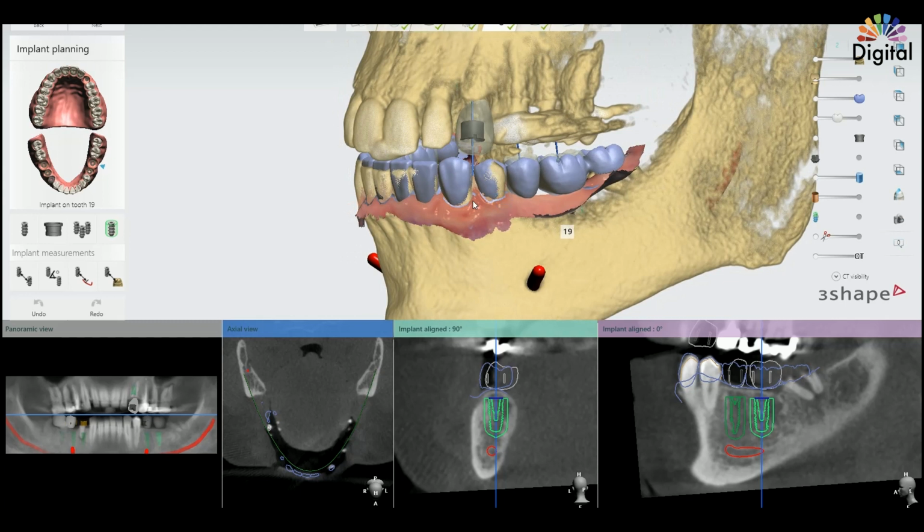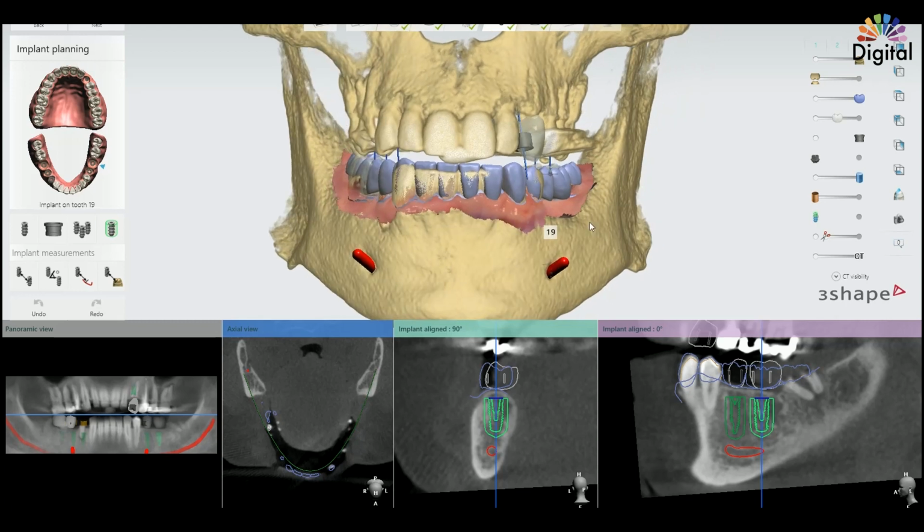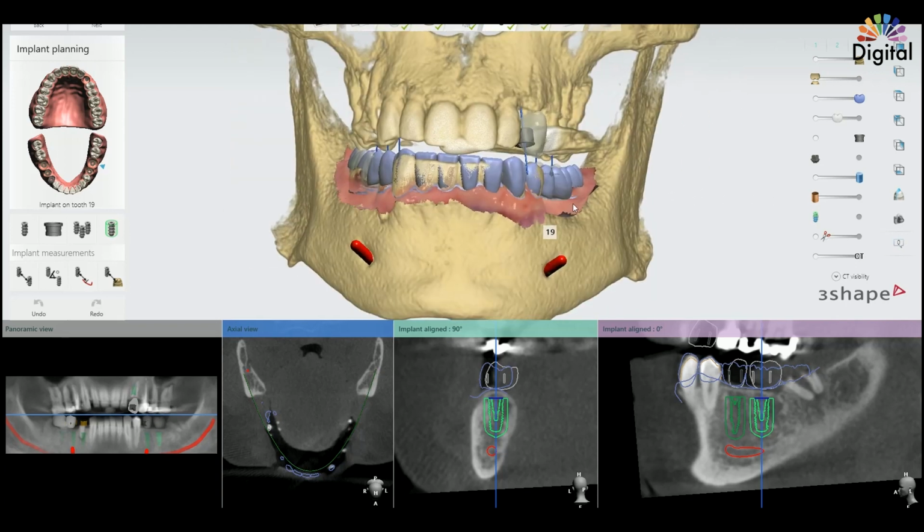And one thing, please guys remember, in the Implant Studio there's no merging or alignment function between the original scan and the digital wax up scan. So the digital wax up has to have the same orientation and position information first. Make sure before we import.